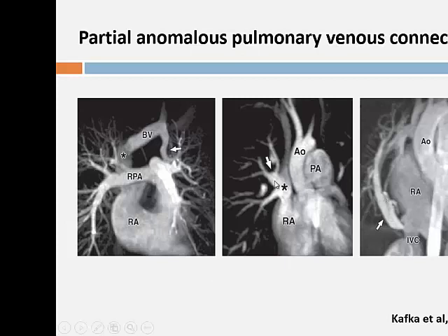Okay, so anomalous venous drainage, you guys are all the masters of anomalous venous drainage. So you know that the left upper lobe must join into the brachiocephalic vein. The brachiocephalic vein comes down and eventually makes its way back into the RA. Okay, and here you can see that there's your SVC. Do you see all these vessels draining into the SVC? So this is of the right upper lobe, and this is what we would describe as scimitar syndrome.